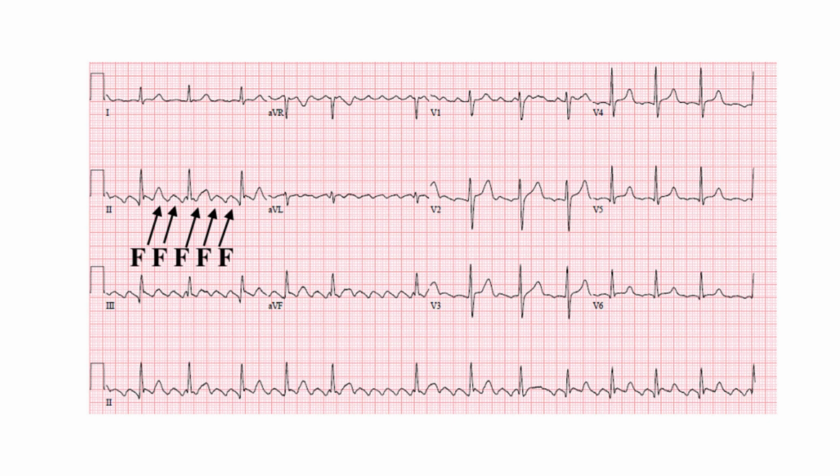a division of 300. In contrast, atrial fibrillation shows no organized flutter waves, only chaotic, irregular baseline activity with an irregularly irregular rhythm. Atypical atrial flutter arises from different circuits, often in the left atrium, and produces irregular, non-sawtooth flutter waves, making ECG diagnosis more complex.